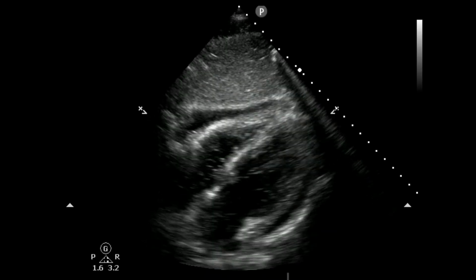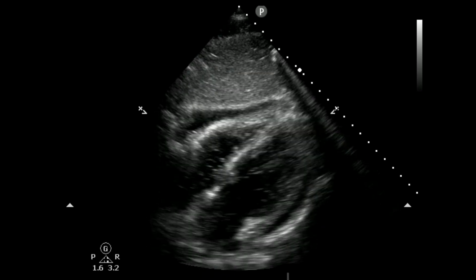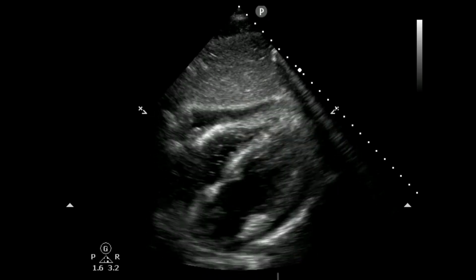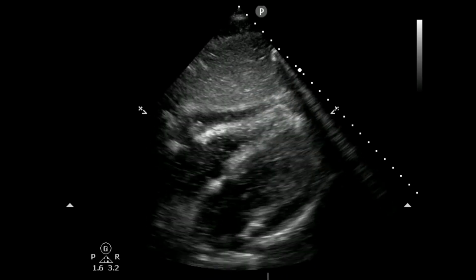And so the question was then asked, can the ultrasound help us identify more of these different things that I can decide to intervene upon in the trauma bay? With that question as the framing, we came back and said, hey, look, the ultrasound can help us find if there are problems in the thorax. We can find hemothorax, we can find pneumothorax, and that might help us identify some of these patients in extremis earlier in the trauma resuscitation. So that's going to be the topic of today's conversation, the thoracic FAST, right? And the goal of the thoracic FAST is to evaluate for pneumothorax and thoracic free fluid.